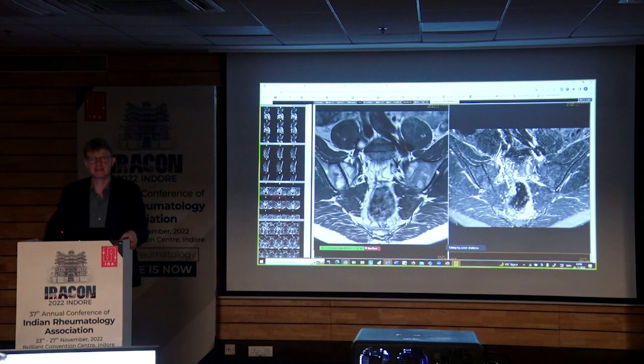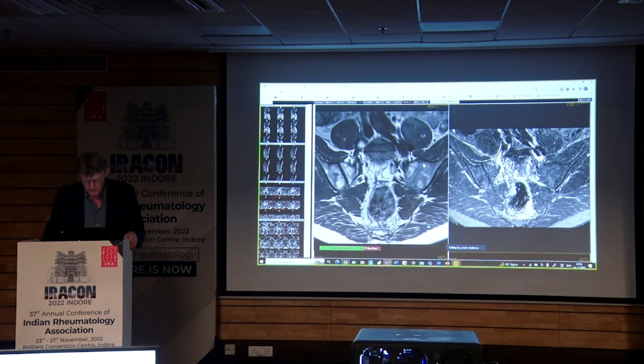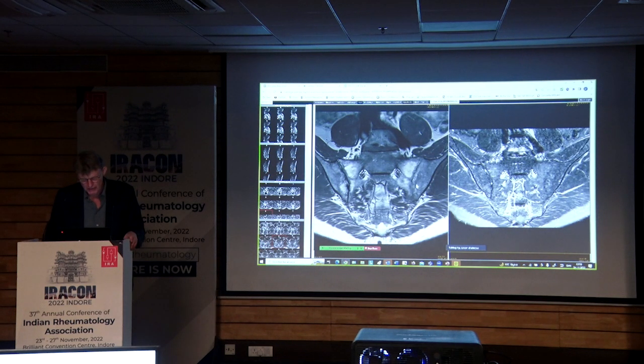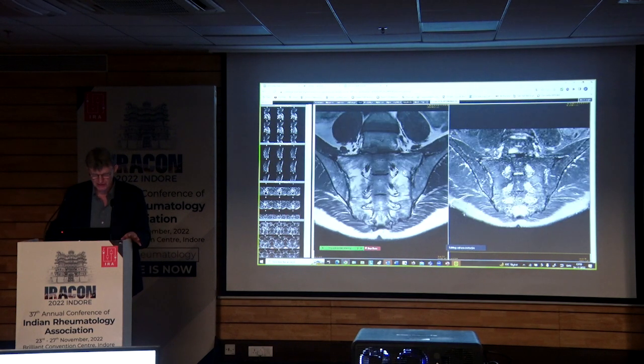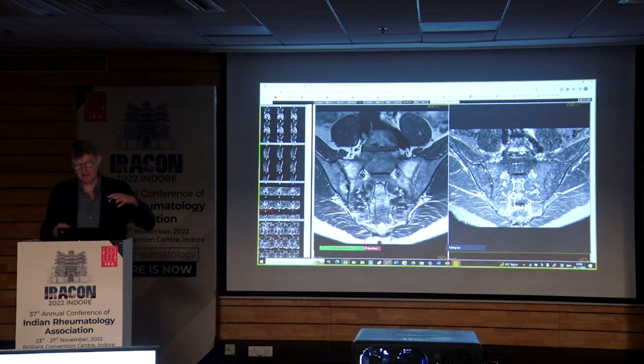The most striking thing is that there is, you say, ankylosis and lack of joint space here. We take it slowly. Already here, there isn't much of a joint space. You can at least somewhere follow the line across, so there is definitely ankylosis. There's also some joint left, and thereby I would agree with you that in certain areas you will find the normal bone down here, a black line, and thereby there's also a backfill in some slices. So I agree with that. Some of you wrote this. There's also some fat infiltration at different locations, mainly in the sacrum, but also a little bit down here, close to the joint. It's not always very homogeneous, but it's definitely fat infiltration related to SpA.